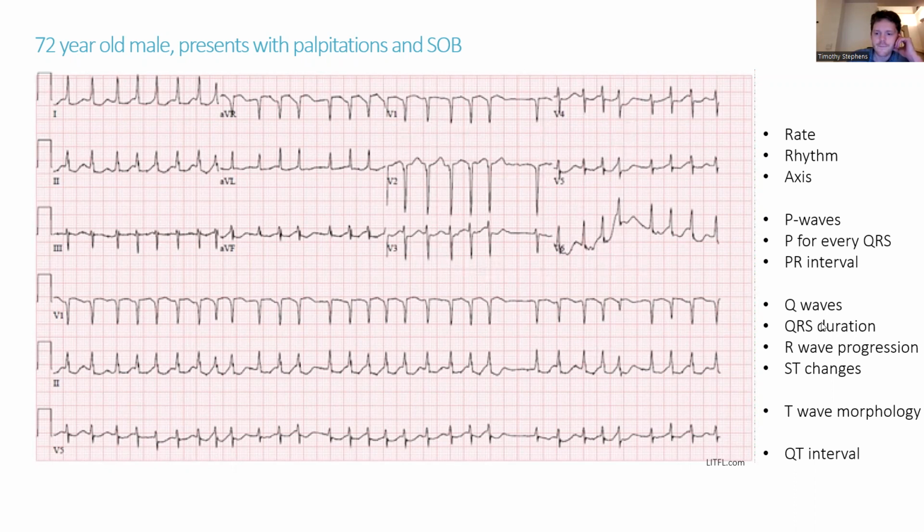And then the ST changes here. Something else to look out for here is some ST depression. So we can see here, particularly in these lateral leads, it does look like there's a bit of depression going on here. Not a lot, but a little bit.